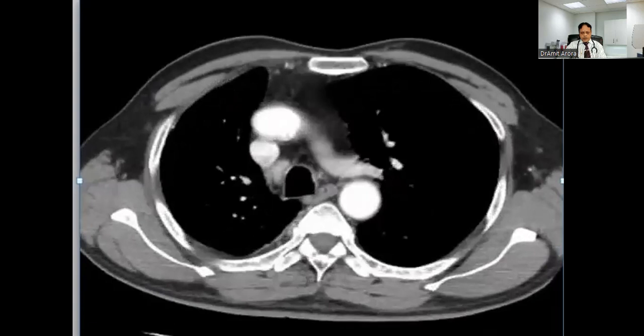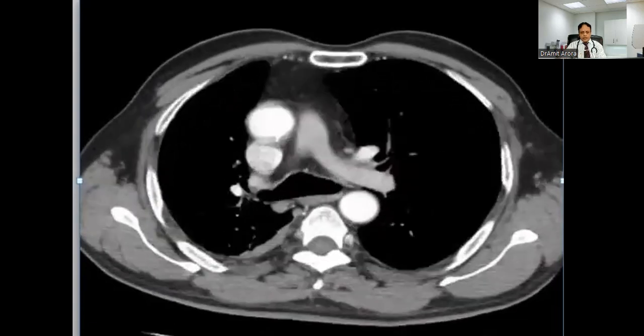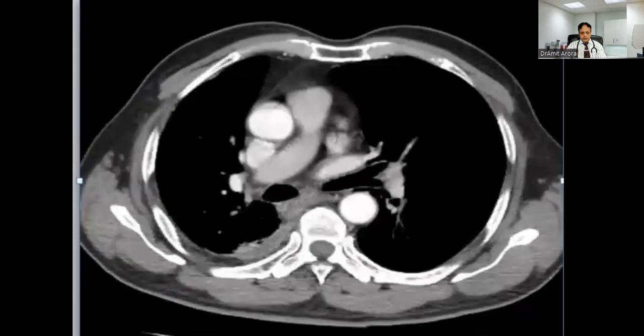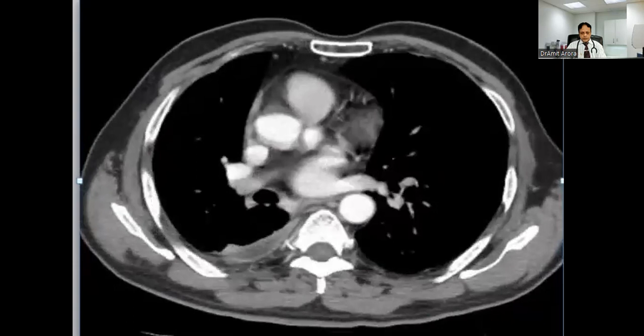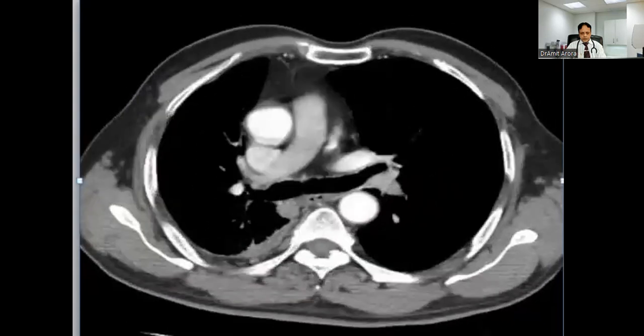Friends, this comes with learning and practice. I will be giving you a lot of slides for practicing. Friends, here you can see a new structure emerging.